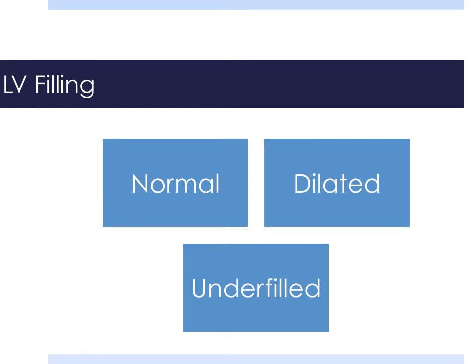This should be one of the main features of the focused ultrasound assessment: assessing whether the problem is in the pump, so whether there is heart failure, pump failure, or whether there is actually nothing wrong with the heart and the problem is in the filling status of the patient, because we have a vasodilated patient, or a patient that is quite behind with fluids.